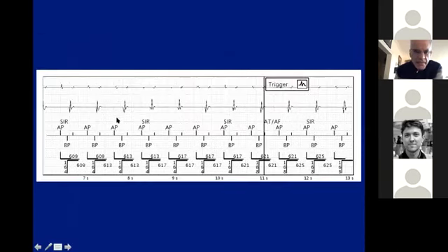And then A pacing, and here is the same thing, right? It is also possible that the amplitudes changed a little bit, right? Because A pacing versus A sense. And this is an example of an appropriate detection. Again, the device mode switches for that. Inappropriate mode switching because of the far field signal. And the same for the pacing, for the same reason, right?